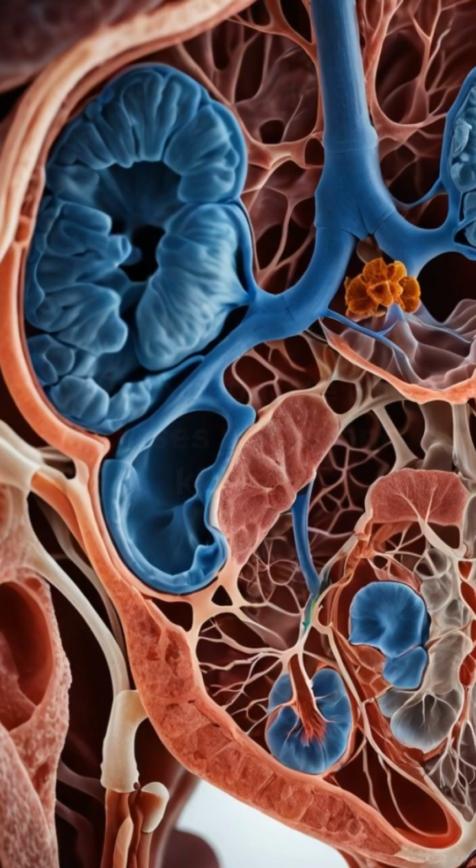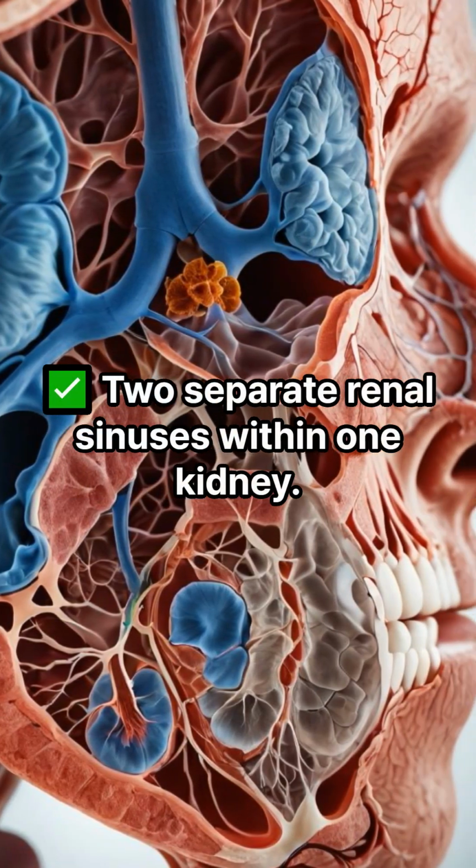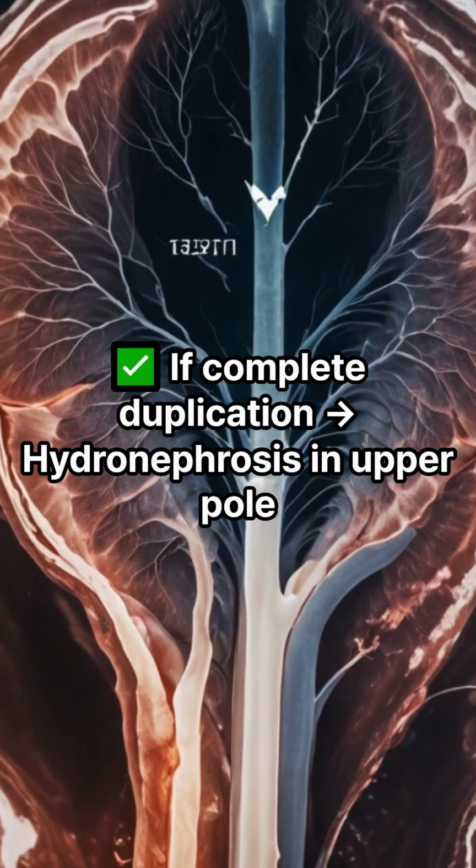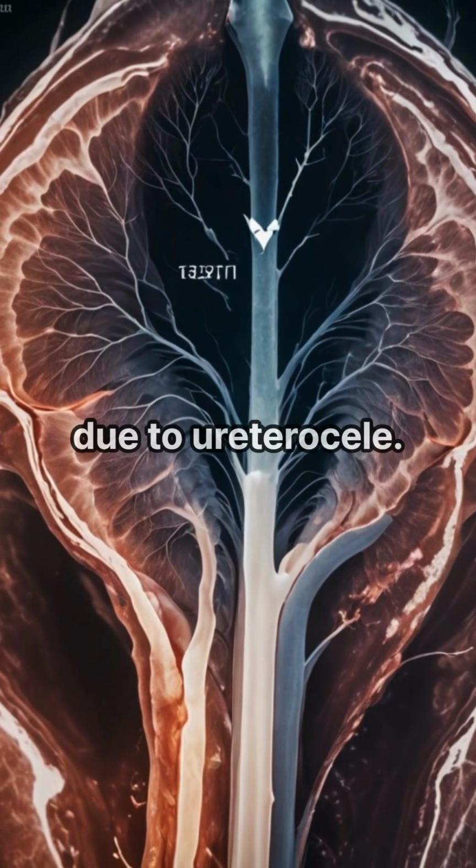Sonographic appearance. Two separate renal sinuses within one kidney. Upper and lower poles may have different echogenicity. If complete duplication, hydronephrosis in the upper pole, due to ureterocele.